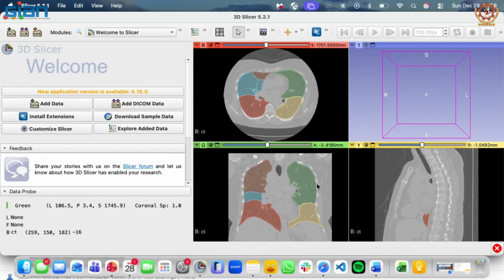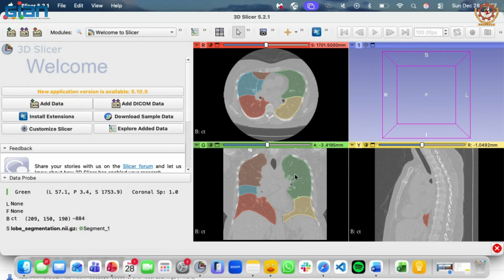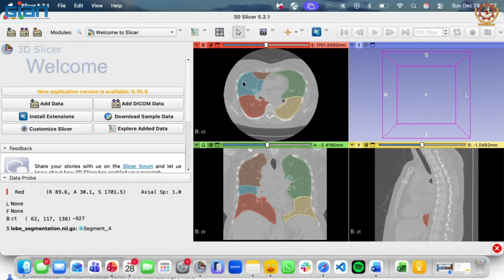That's a good question. What do you think it is? What's LPS in CT? Okay, see, put your cursor here and just scroll.